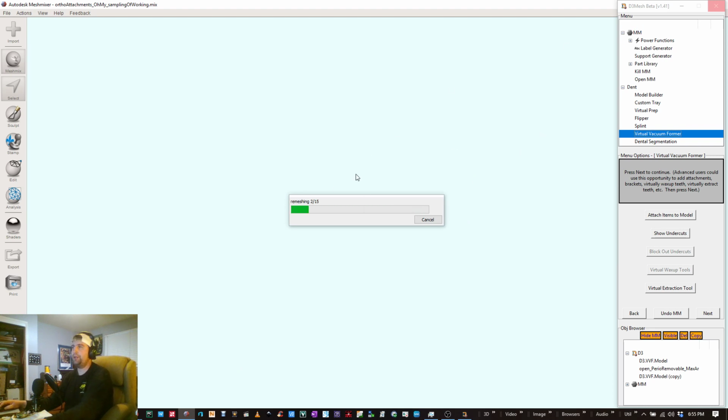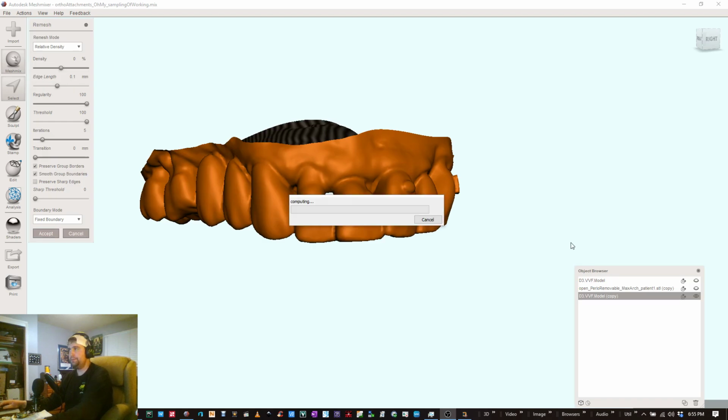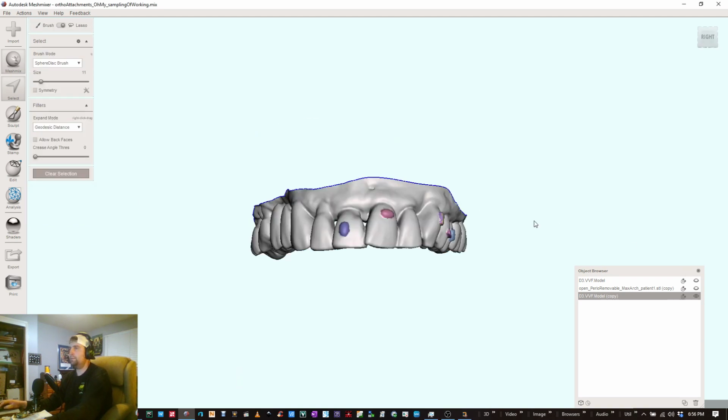Let me show you. I have one model in the scene here that has all the attachments, so I'll hide the one I'm working on. Let's do its thing real quick. Okay.